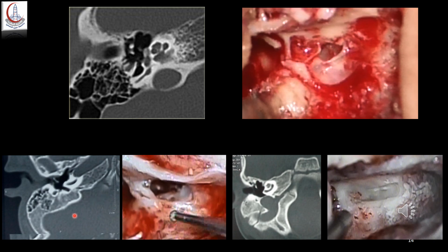On the other hand, in some patients, the mastoid is pneumatized, but the facial recess is sclerosed. And here we expect a lot of drilling, and we have to take very good care about the level of the facial nerve because it is at danger of injury during our drilling. In other patients as well, both the mastoid and the facial recess are sclerosed, and here we expect lots of drilling in solid bone, putting all structures at a danger, and we have to take very good care to avoid injury to the facial nerve or to the chorda tympani as well.